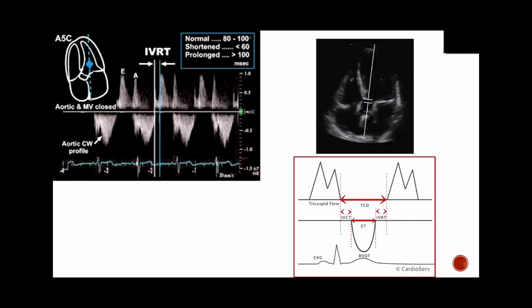All right. So on a lot of the echoes you see grade 1. Is that any time, it will say mild, is that really any time the E has a small amplitude in the A wave? We're going to go over the algorithm for that. Okay. Yep. All right. So we spoke a little bit about isovolemic relaxation time here, right?